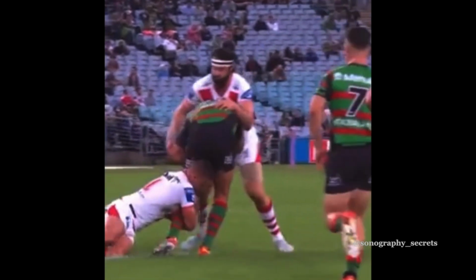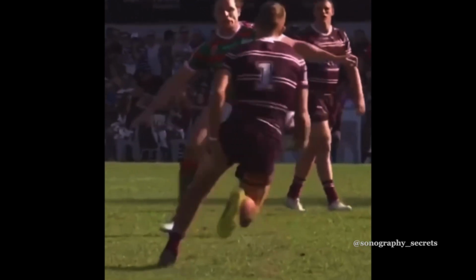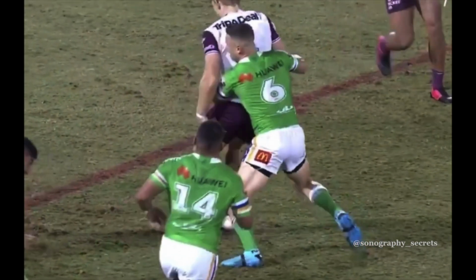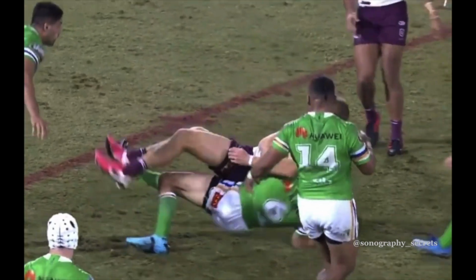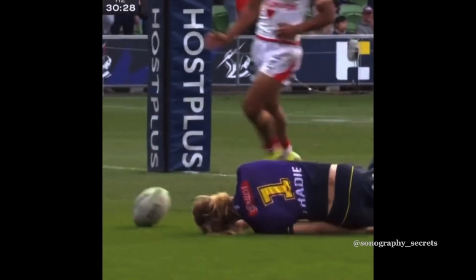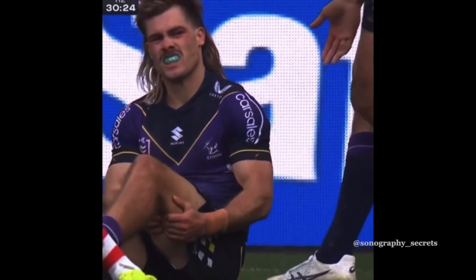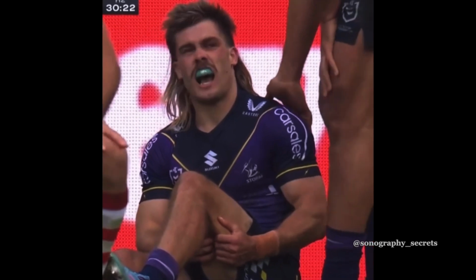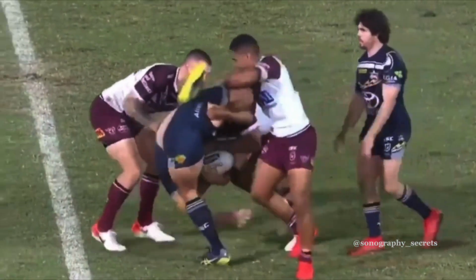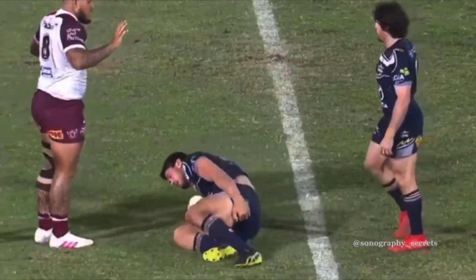The other way you'll tear your hamstring is when you are running at pace. The hamstring will act to slow down that lower leg, and as it extends, you are prone or susceptible to a musculotendinous junction tear. Either way, they're clinically pretty straightforward. So if your patient has a plausible clinical history of a hamstring tear, your worksheet should never read NAD. If it does, it's not because there's no abnormality, it's because we've missed it.